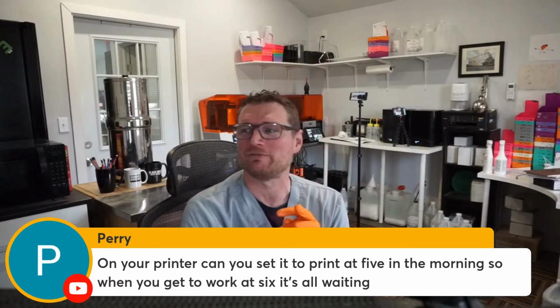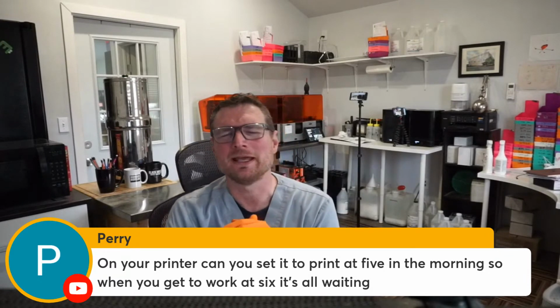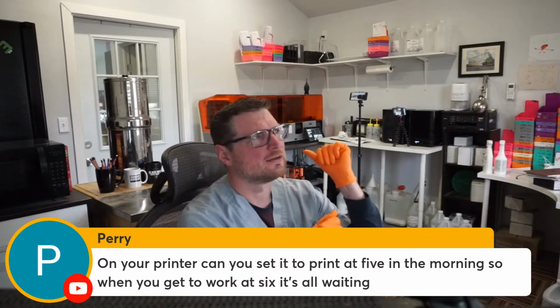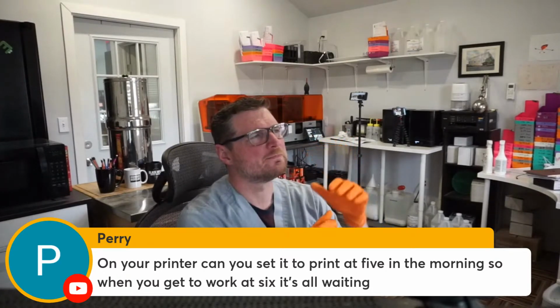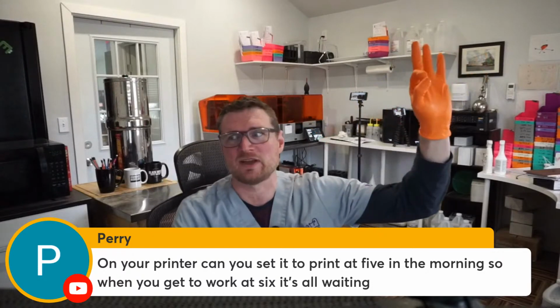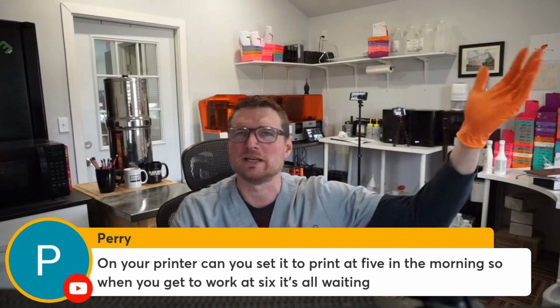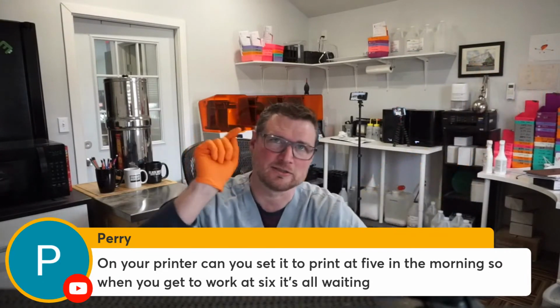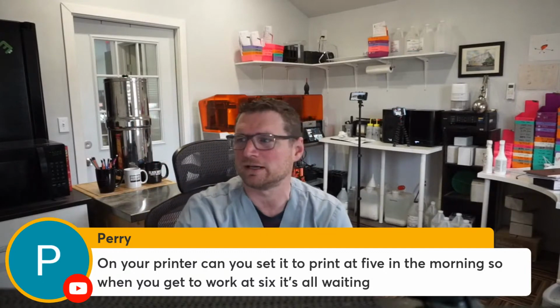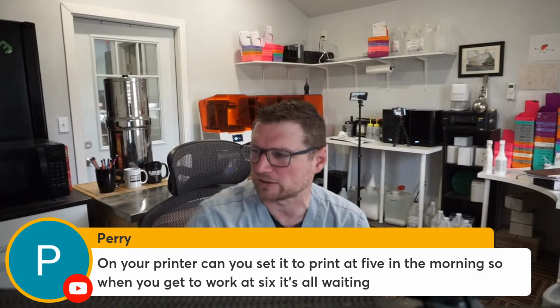I've never asked that. That might be a Formlabs printer thing, but I would assume if you can send it there, I bet you could send it there and then activate the print from home at 5. When you wake up and start getting ready, you can say send the print and start it, and you could do that. I don't know about scheduling. That's a good question.